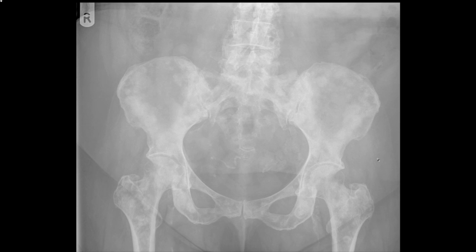The commonest condition by far is metastasis. In a man, prostate cancer would be the most likely. This is a woman, however, and breast cancer is by far the most likely primary to cause this appearance, particularly if the patient has had treatment for a breast cancer, as breast cancer metastases often sclerose in their healing phase due to the treatment. Other primaries can obviously cause such appearance as well.